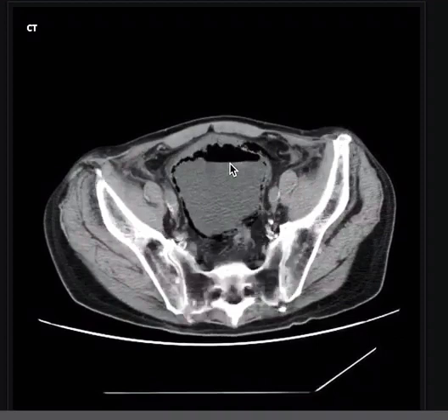What clinical information would support your diagnosis, or would you like to ask for? We could say, for example, diabetes, uncontrolled diabetes, if the patient is septic or feverish or complaining of dysuria.